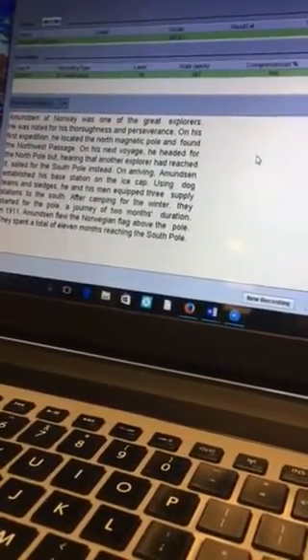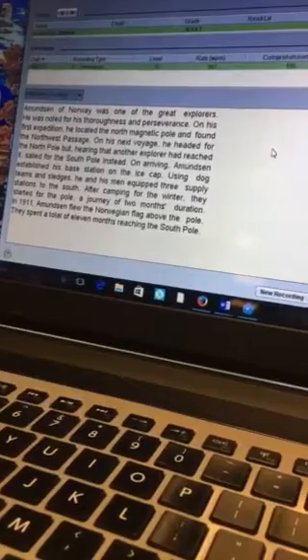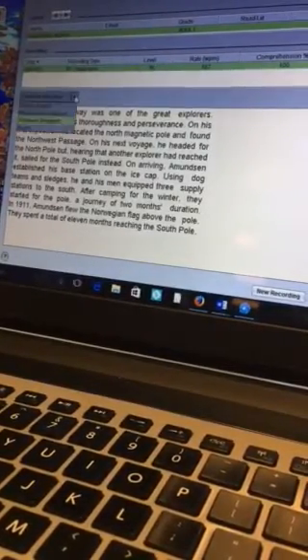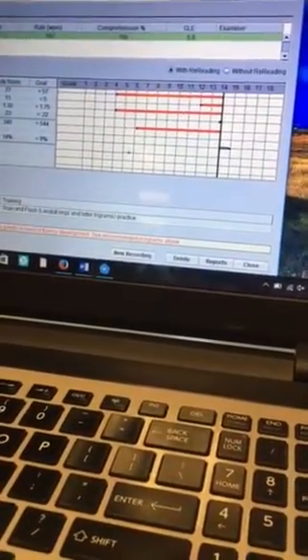This is a 10-line passage. We're going to tend to see the longer the passage is, the more we're going to see that comprehension go down as the child's brain is really fatiguing. So overall, next what's going to happen is the computer measures a bunch of the data. So what we're seeing is the black line is where we would like the data to be ideally. The red line is showing where your son was testing.